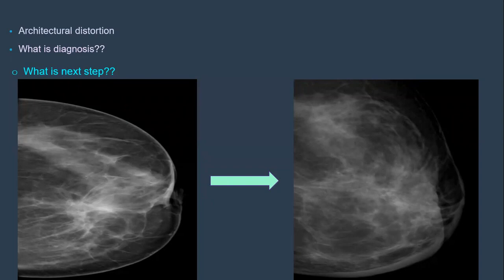No, no. So it will be suspicious. This is a suspicious finding, and in that case she had a recurrence. She had recurrent cancer. So we'll go further, we'll go to ultrasound, and we might do a biopsy if we can find anything to biopsy. Otherwise, we will proceed to MRI in this case.